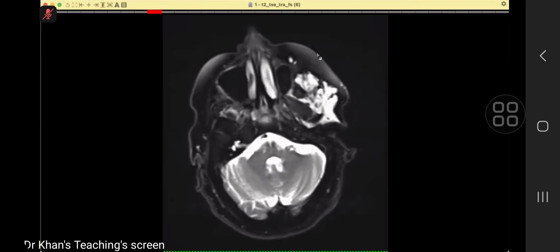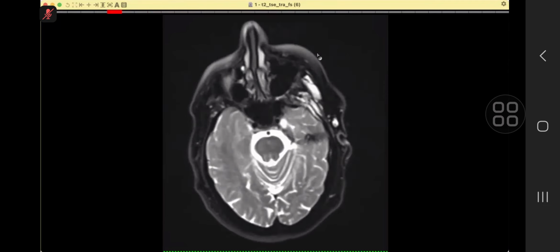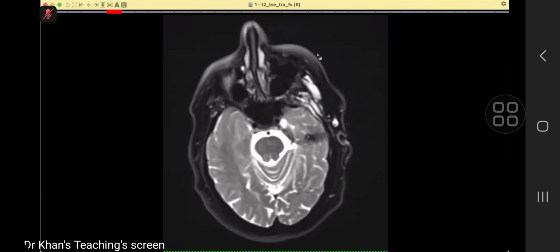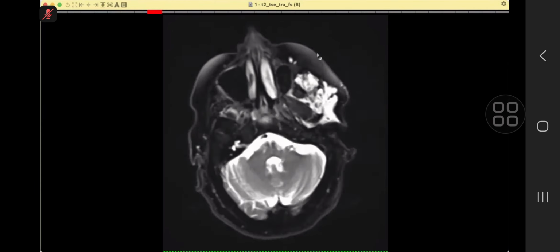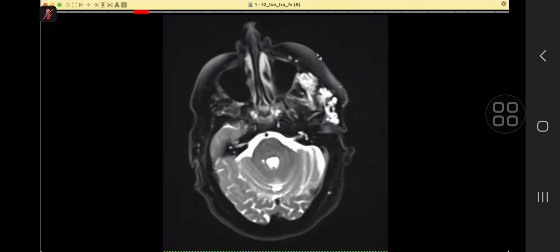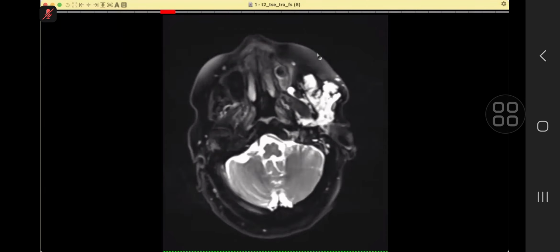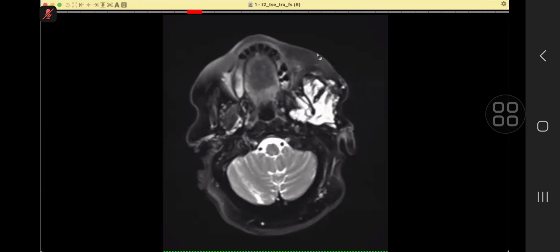Sir, in this MRI of the neck, in the T2 sequence, it is quite significantly hyperintense. And it is eroding, or you can say extending through the calvarium into the subdural spaces, but the brain still looks spared. Moreover, again, it is causing some bony scalloping of the lateral margin of the maxillary antrum. Pterygoid muscles are surrounded by it, but not invaded by it.